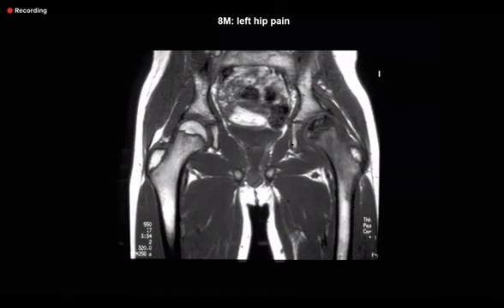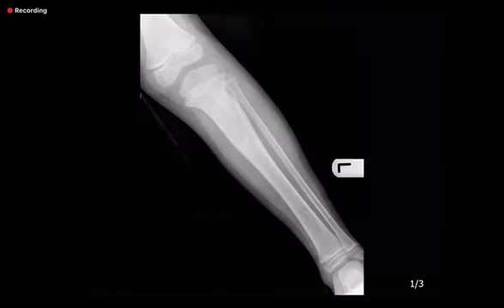So is this Perthes disease? Yeah, simple as that. And you can see that the epiphysis is collapsed. It is smaller in size. It is low in signal. And similarly, a scaphoid fracture has come in the exam. So it's very easy that it will be low in signal. When it becomes chronic, it will be low in signal on T1 and low on STIR. When it is more acute, it will be low here and high on the STIR sequence. This is your last case.